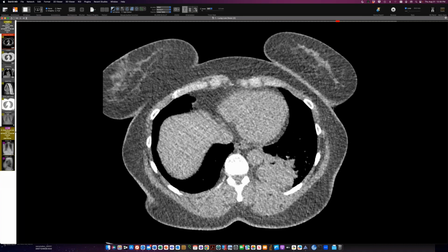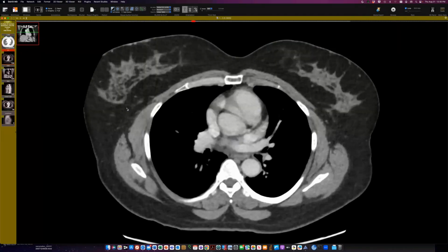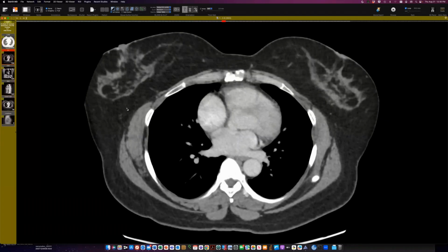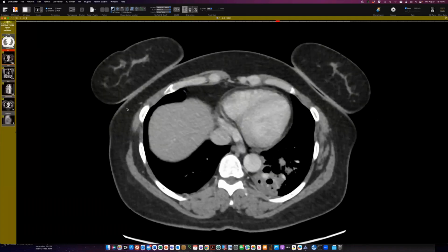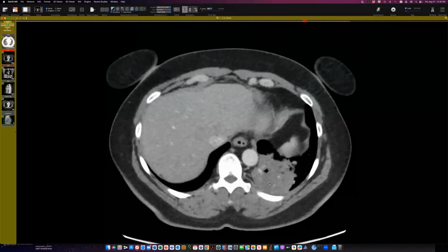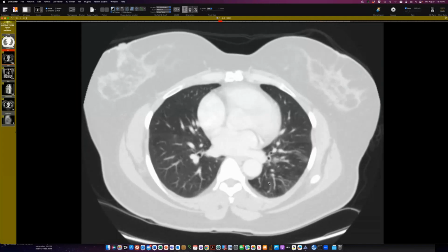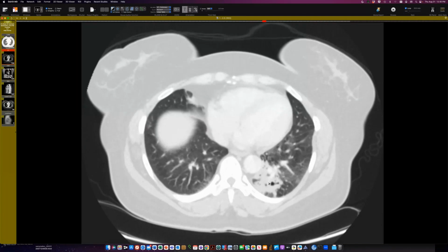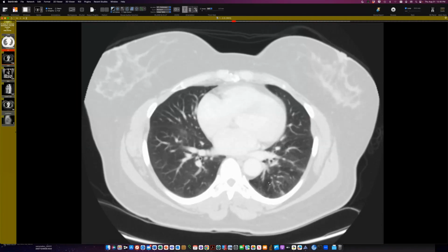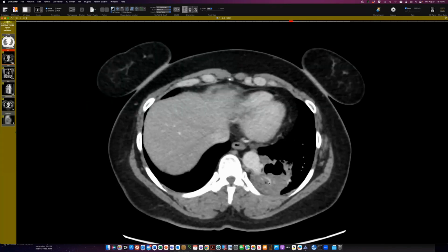So ultimately, she had a contrast CT scan, and it all comes clear because as we go down, there's a big honking artery coming off the aorta going into this lowish attenuation lesion down here, and this is a sequestration. So the findings aren't all that clear cut on the earlier imaging. It's only the contrast study, I think, that really enables you to nail the sequestration as the cause of this cystic mass down here. And it was infected.